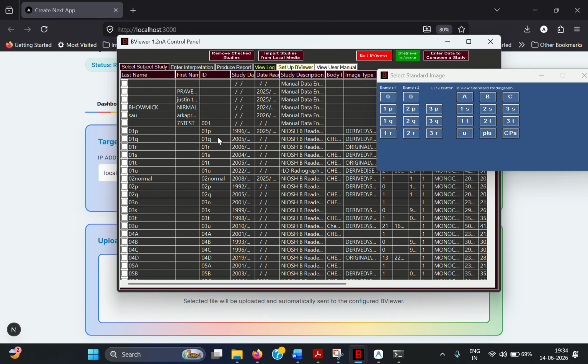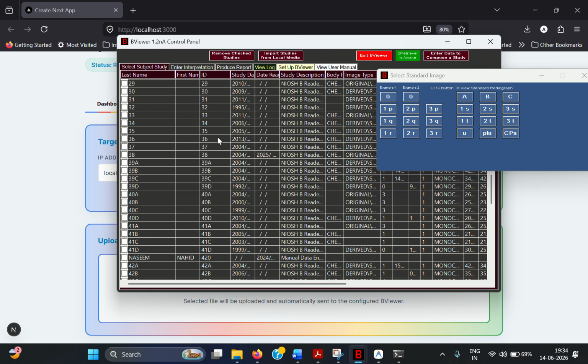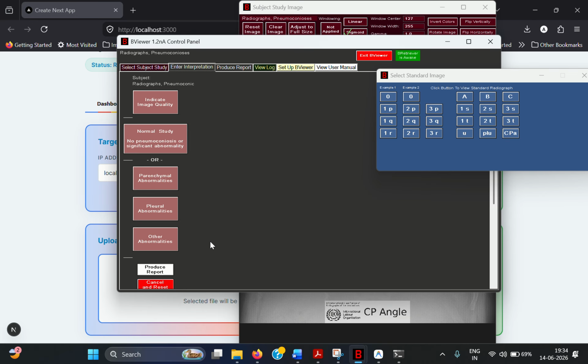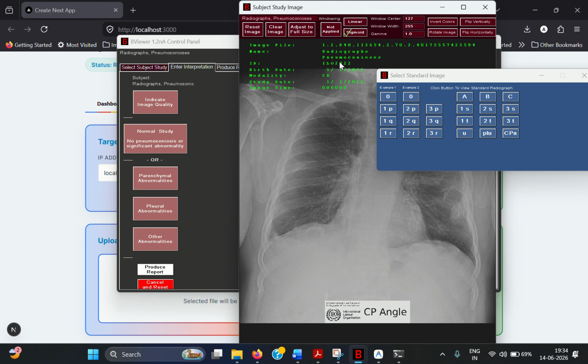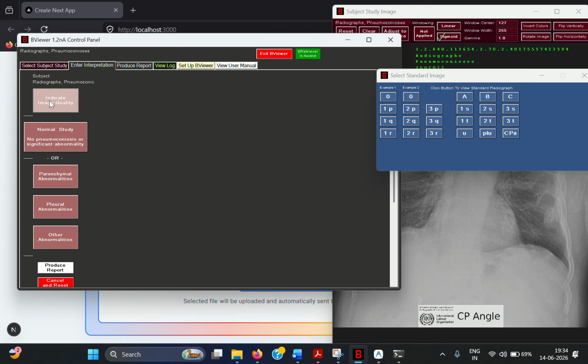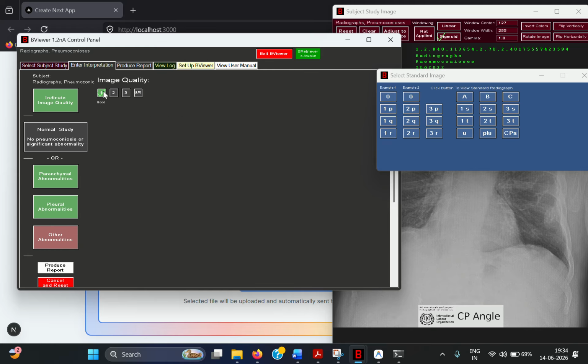Now, after that synchronization and after getting that image, how can we actually proceed with the ILO classification? Let's assume this is the image and it's opened here. Now I can do the actual classification, like image quality: accept or not. I mean, image quality class one, two or three. If it is two or three, then based on that I can proceed.